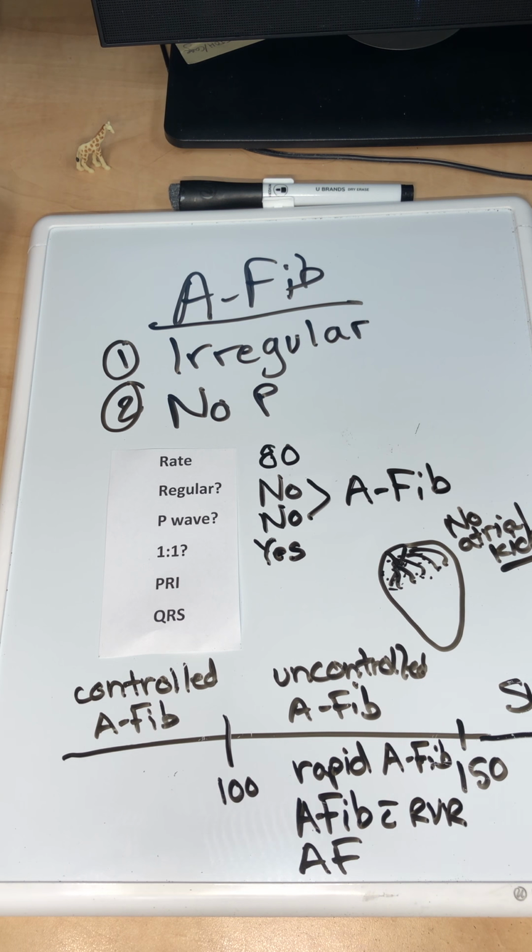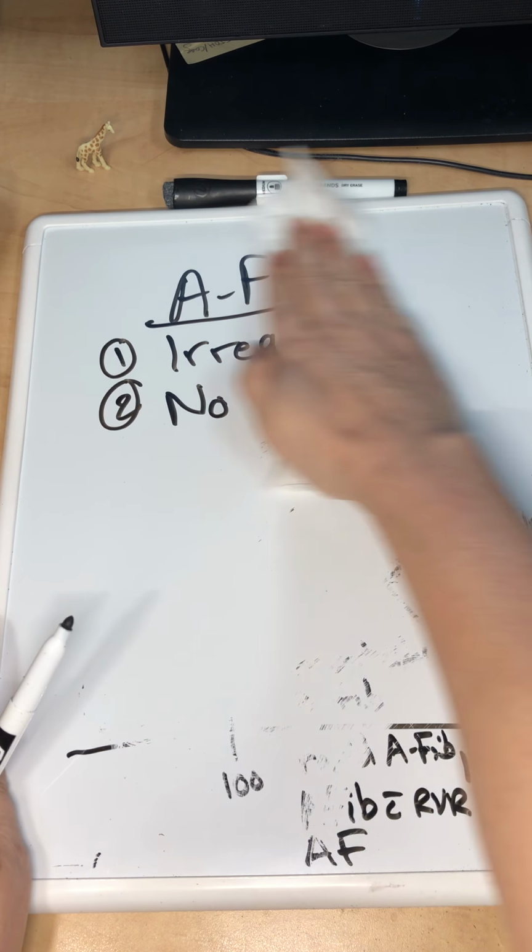Okay. Now, AFib has a sister rhythm, and it's my favorite rhythm. Let's see here.